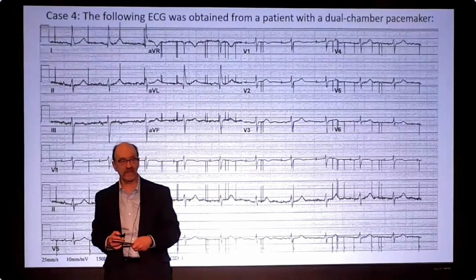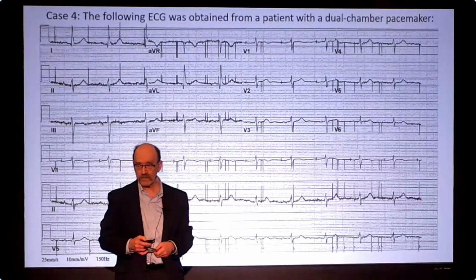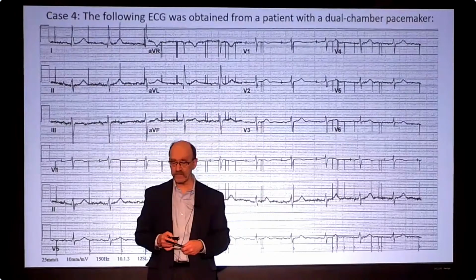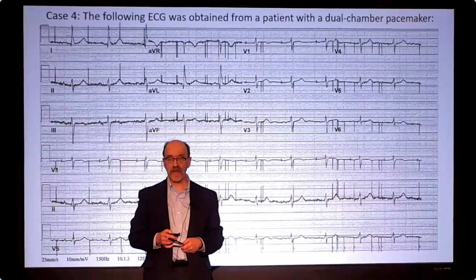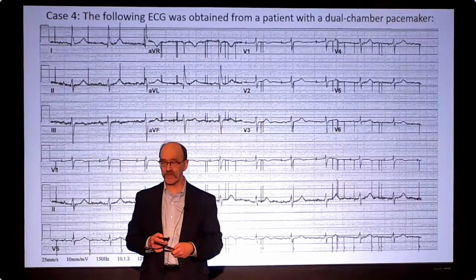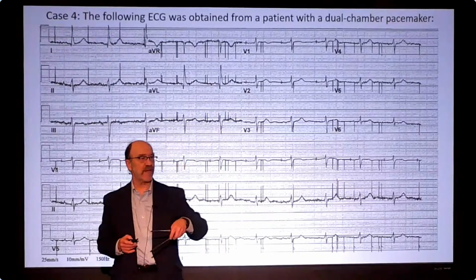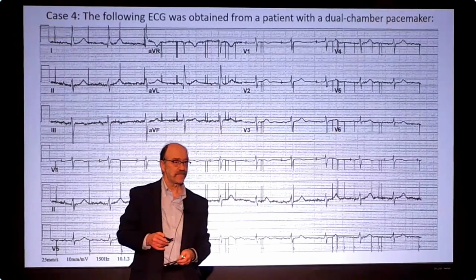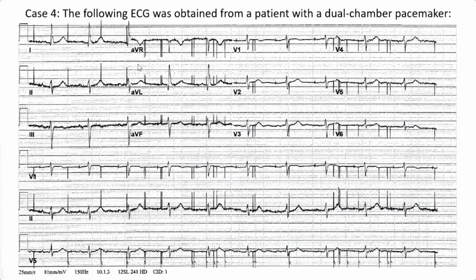Okay, now this is a case I saw about a month ago. Somebody handed me this electrocardiogram. Actually, it was on my patient. What is going on here? Patient with a dual chamber pacemaker. You just pass the mic to a table to your right or left. You can pick. So the subject is, what's going on here? There are a whole lot of spikes here.